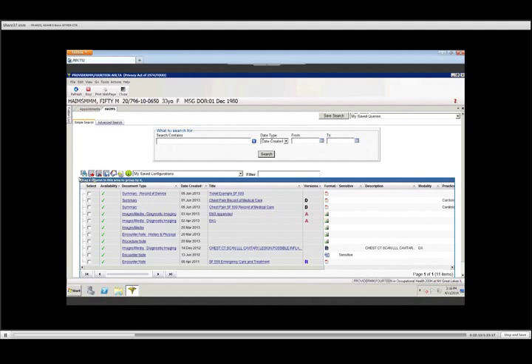The second icon is my export grid data. If I click on this, it will export all of the assets up to the most recent 100. HAIMS will only display the most recent 100 assets. So for example, if I wanted to search for an asset that might be asset number 260, I would need to use my search contains and the date range search in order to search up any asset that is beyond the most recent 100.